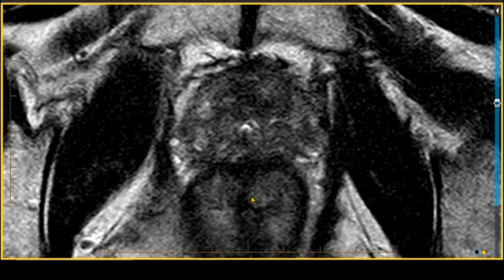This patient was being followed with active surveillance. The problem is that the transrectal ultrasound-guided biopsy under Gleason scores the prostate cancer in up to 30 to 40% of cases. An MRI was obtained in this patient because the PSA was going up very rapidly and had recently reached a level of 6.0. So the clinician's concern was that the patient had higher Gleason score prostate cancer than had been previously detected with just the transrectal ultrasound-guided biopsy.